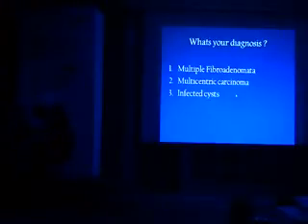Infected cysts. A cyst is a cyst. Cysts do not enhance. Cysts are fluids that show only marginal enhancement when they are infected. We didn't see any fluid inside the cyst. This is a contrast enhancement, and the masses are totally enhancing. There's no halo inside to denote there is some fluid.